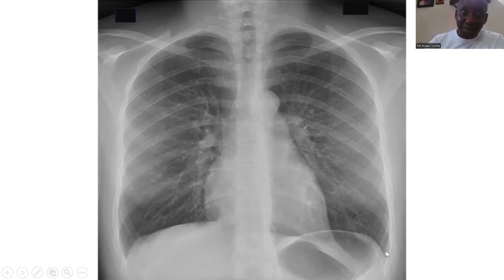and it is not unexpected because the liver is on the right side of the abdomen, which pushes up the right dome of the diaphragm. The lucency here tells you that there's gas, and this is usually called the gastric bubble. It is usually on the left. Okay.